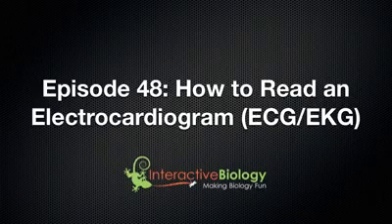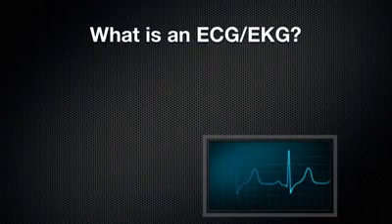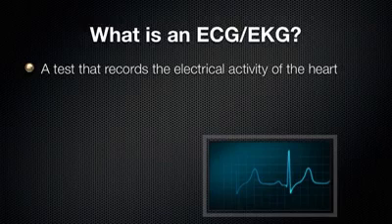My name is Leslie Samuel, and in this episode, episode 48, I'm going to show you how to read an electrocardiogram. For short, it's called ECG or EKG. So let's get right into it. First, I want to answer the question, what is an electrocardiogram? An electrocardiogram is a test that records the electrical activity of the heart.